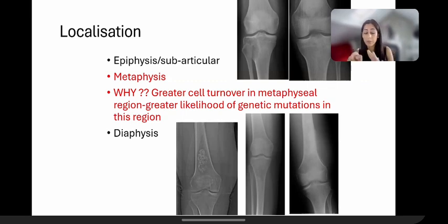Also, one point to note, which we discussed previously, there are only 5 densities. So what happens is you only see a tumor when 30 to 50% of trabecular bone is destroyed. Your trabecular density is highest at the epiphysis and the metaphysis. So a lesion in these two locations is better seen and seen earlier as compared to diaphysis, because in the diaphysis your trabeculae are sparse.